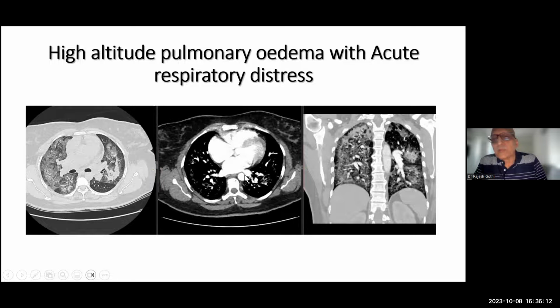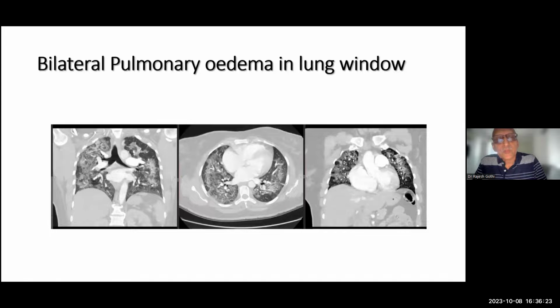And the pulmonary edema had been quite severe. He also showed an infarct over here in the left ventricular apex. And he was managed conservatively. He managed to survive. So this is what pulmonary edema can look like. And you must be able to interpret and diagnose it in the clinical context. You can see how large the RA is. It tells you that the pulmonary edema is causing severe RA pressures, right heart pressures.